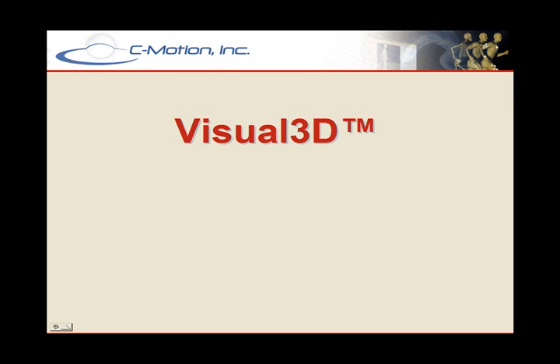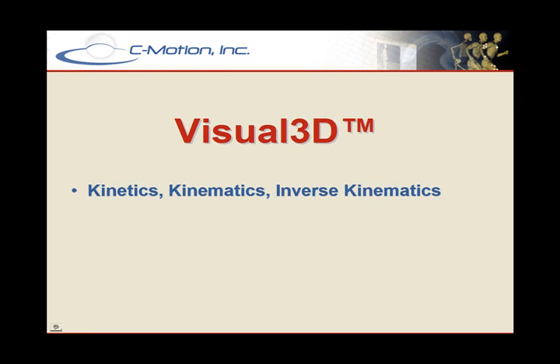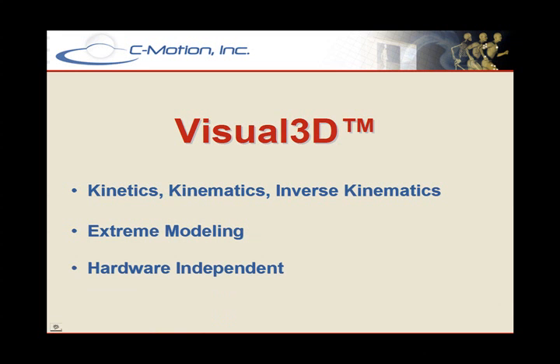Visual 3D can do all your kinetic, kinematic, and inverse kinematic calculations. It has the most advanced biomechanical modeling capability available. It supports any kind of marker set, from conventional gait, clusters, and vendor-provided setups to custom-developed minimal marker sets. Best of all, it doesn't matter what motion capture system you have now, and it lets you switch systems without ever losing data.